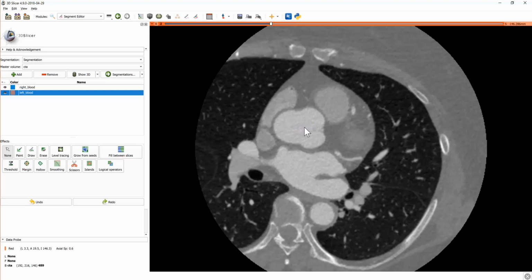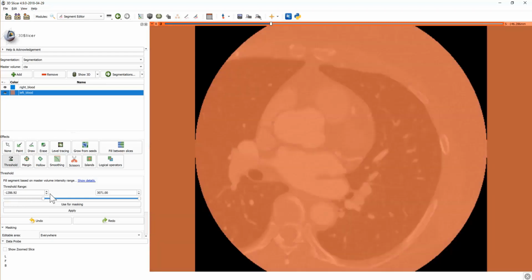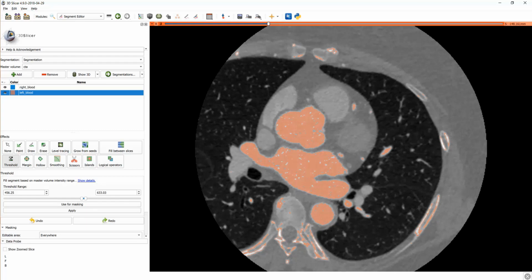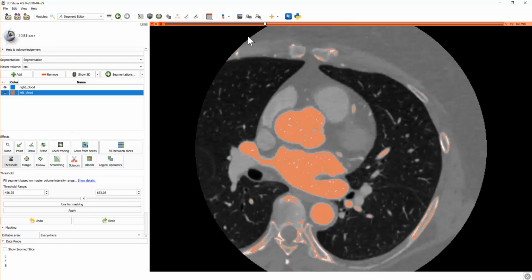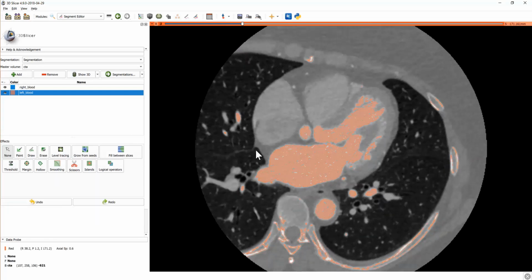So say we just wanted to threshold out the arterial blood. Well, I kind of scroll over here and notice that it's generally falling between 450 and 650, let's say. So I'd use the threshold tool and drag it to 450 and drag the top end to 650. Roughly. And you can see that we've more or less segmented out our left heart. Okay? You have to click apply to make that segmentation happen and take.